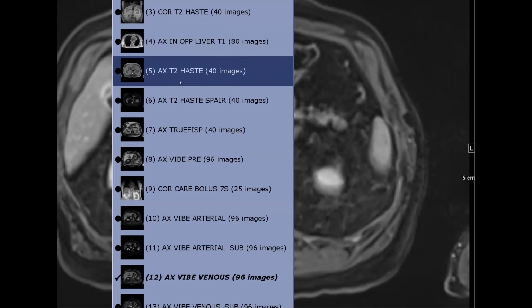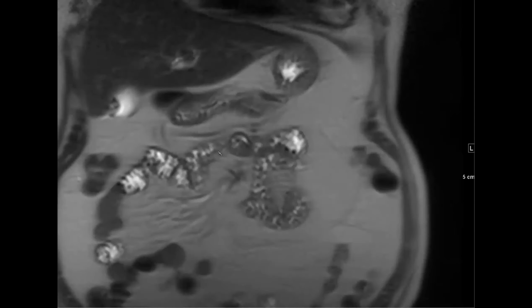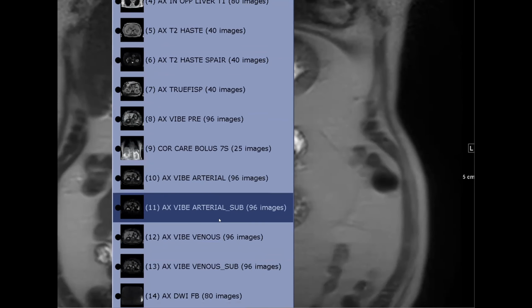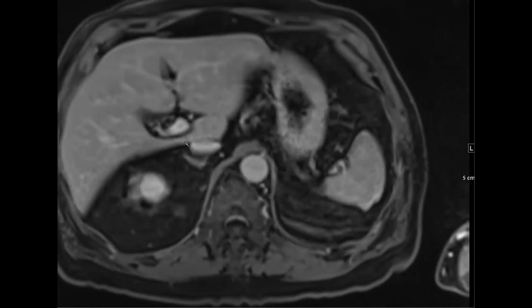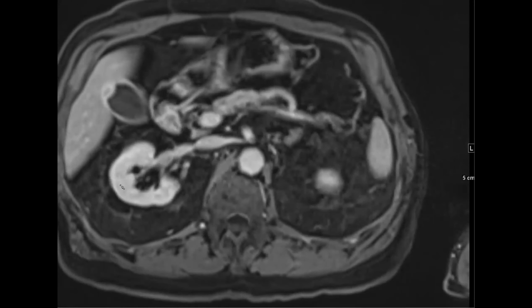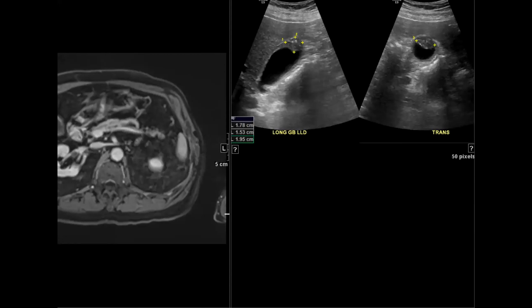So we thought this was adenomyomatosis, and that these are the cystic spaces like the Rokitansky-Aschoff sinuses, and these dark areas are like the hypertrophied muscle, and this nice smooth mucosa over it was also kind of confirmatory that this was not a malignancy. So I just thought it was a nice example of what it can look like on ultrasound. And these little echogenic foci are probably the cholesterol in the sinuses.